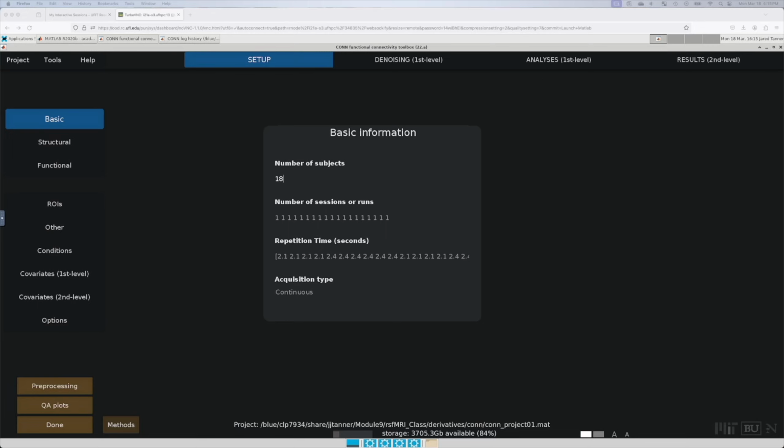I would go in and delete them out of the data set itself in my copy of it and just say, well, I'm not going to use these ones. And then I wouldn't have to worry about this. But this is the other way to do it that's a little less destructive. But again, it didn't take that long to get through this, so you could do it, but that's the process. It's a little bit more involved than some of our other things we've done.